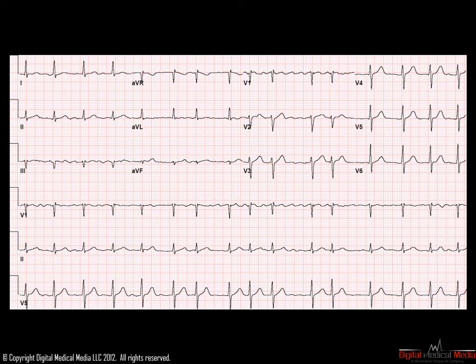The average heart rate is slightly higher than typical. It is difficult to determine heart rate when the R to R intervals are this irregular. However, the first third of the ECG has R to R intervals which are fairly predictable. Therefore, we can take a heart rate from this section of the ECG, 300, 150, slightly lower than 100 beats per minute.